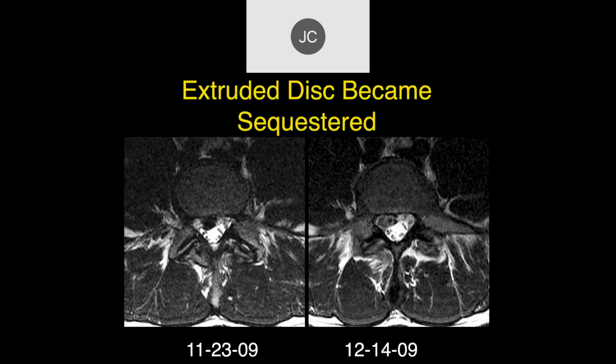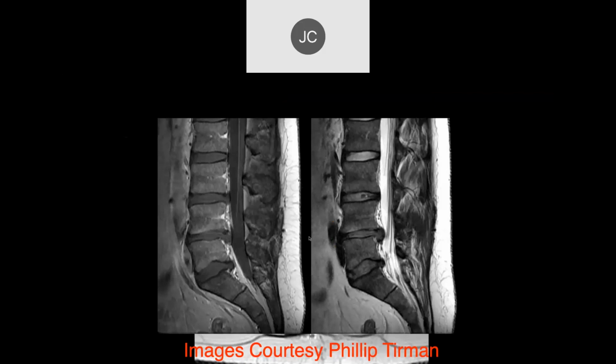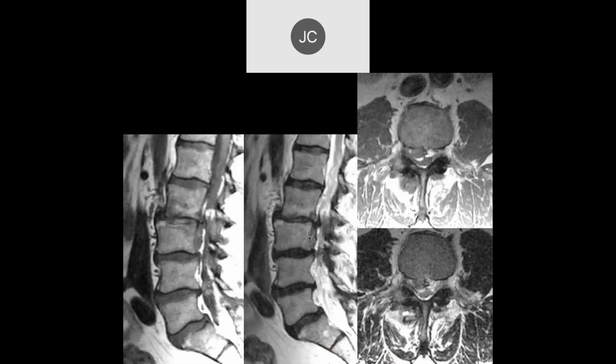I think we continue to follow him for another couple of eventful months, but that will be later in this lecture when we see what happens after this. And this is just some study, an early 3T image showing disc extrusions on an early 3T scanner.